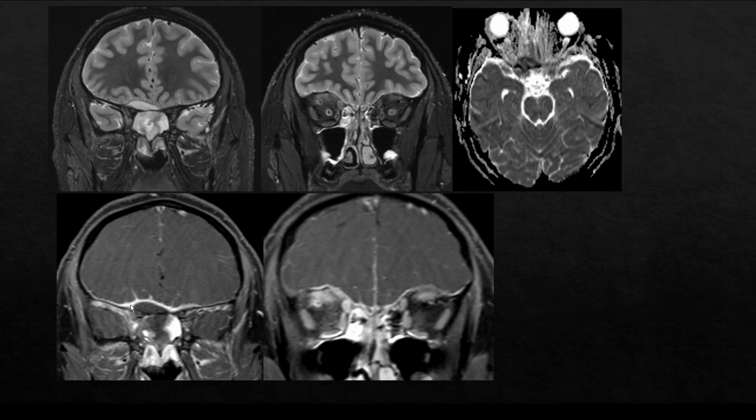We see this smooth, abnormal, thick enhancement of the dura, pachymeningeal enhancement. We also see abnormal enhancement extending along the sulci, which would be along into the arachnoid space, which would be compatible with meningitis. So we have sphenoid sinus disease resulting in an epidural empyema with pachymeningeal enhancement and associated meningitis.